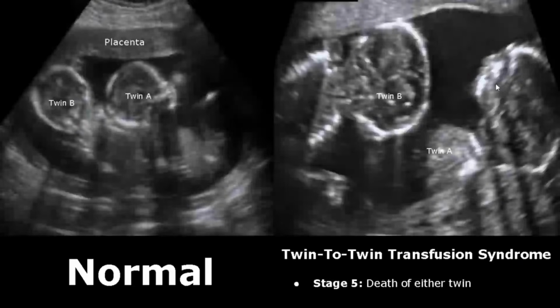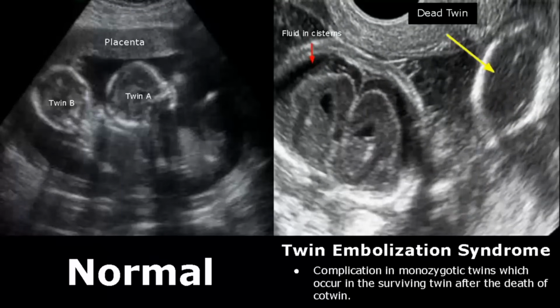In the final stage of twin-to-twin transfusion syndrome, death occurs in either twin. Twin embolization syndrome is a rare complication in the surviving twin after the death of co-twin. The damage is actually ischemic rather than embolic. Most commonly, brain injuries are involved. Here we see fluid in the cisterns of the brain, suggesting brain injury.